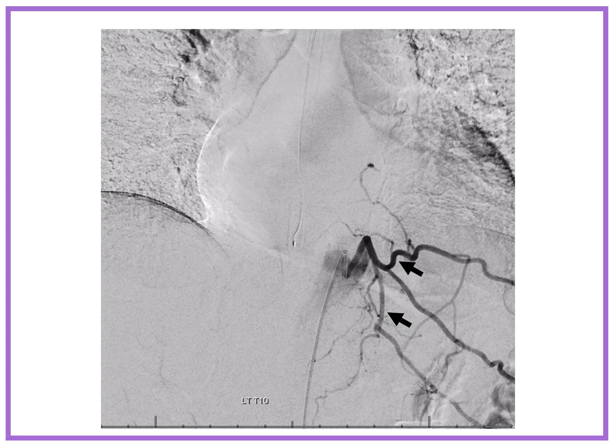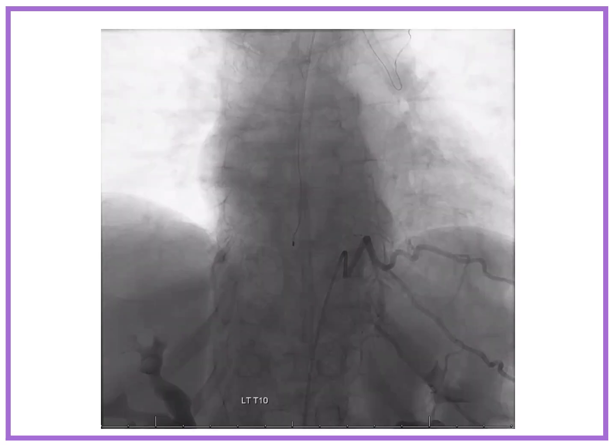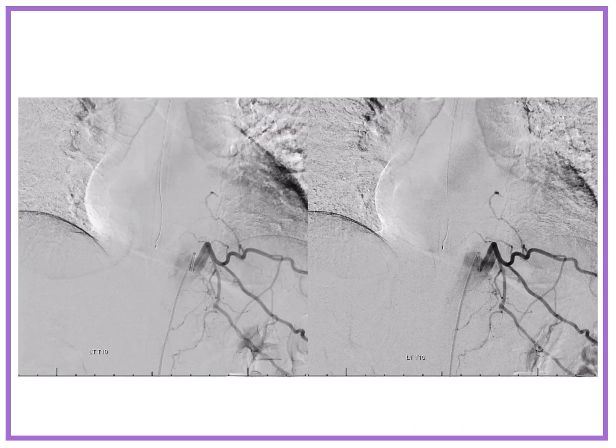So the black arrows are pointing to these anastomoses. From the left T10, we're seeing not just the left T10 intercostal, but the left T9 and the left T11, correct? Here's the native image, so you can see how they're running under the ribs. There's some scoliosis there. That's why the ribs are a little bit weird. That's why the connection between the T10 and the T9 is a little bit squiggly, because that's where his problems are, and that's where a lot of the curvature is.